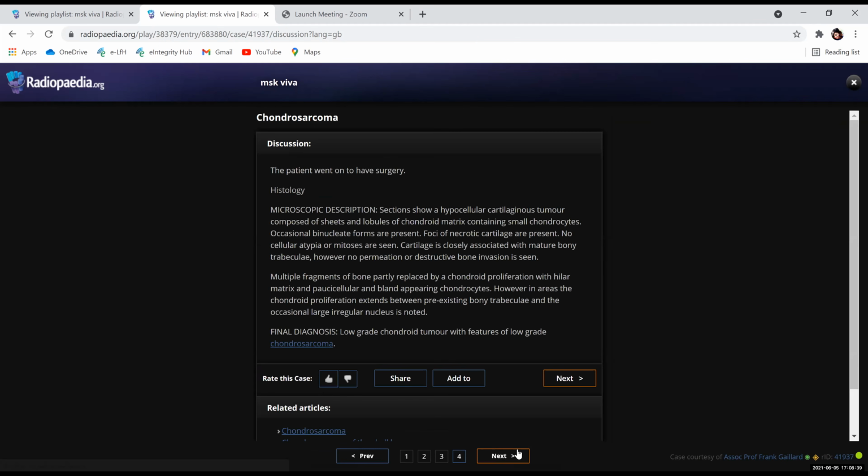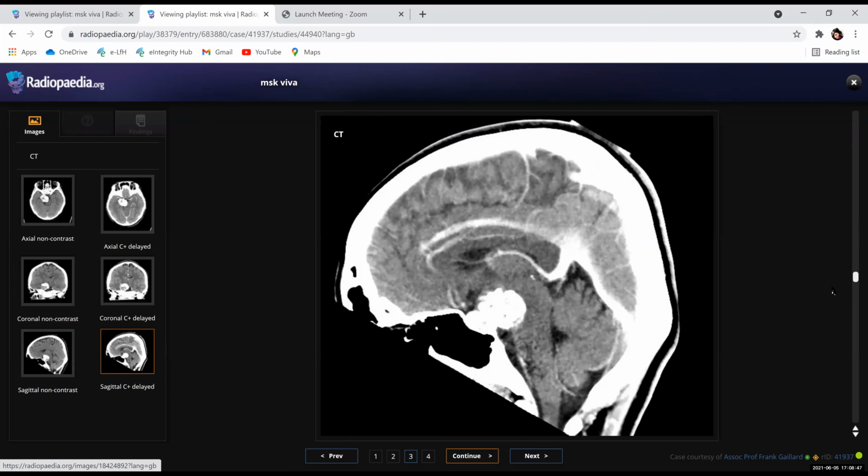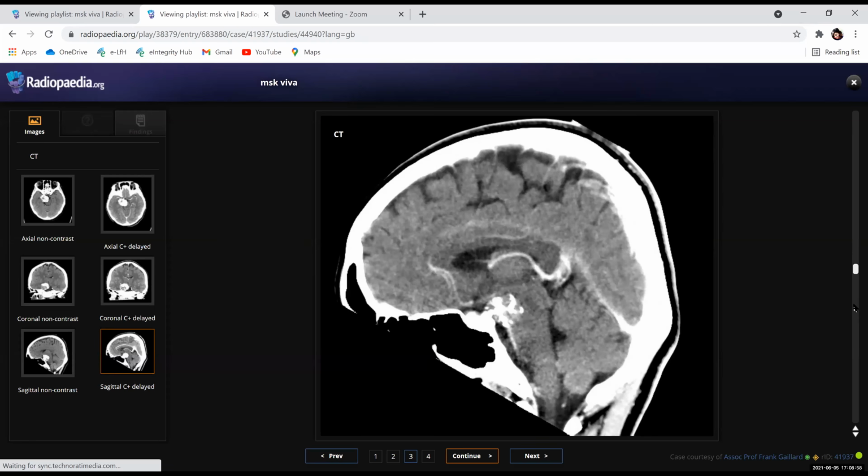We are finished with time as well. So go ahead with the... Okay, here's the CT also. Now you can see it. Yeah, there is some calcification. On CT, this could be a bone tumor, like with the chondroid matrix. But I don't think it's a chondrosarcoma. Maybe, I don't know. It's a chondrosarcoma actually.